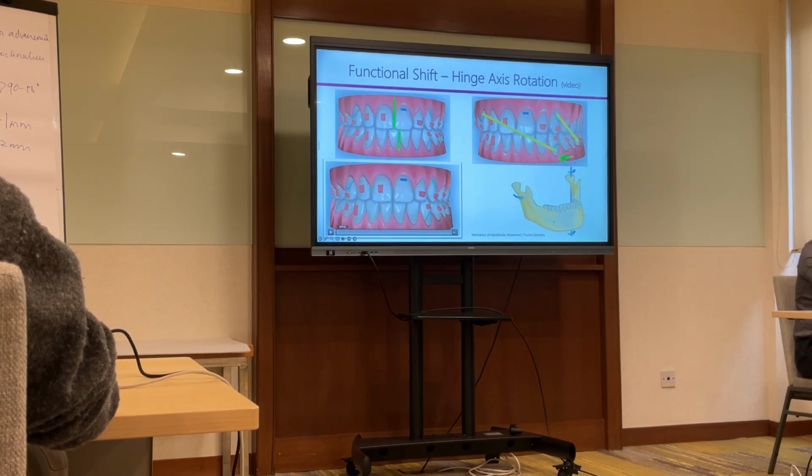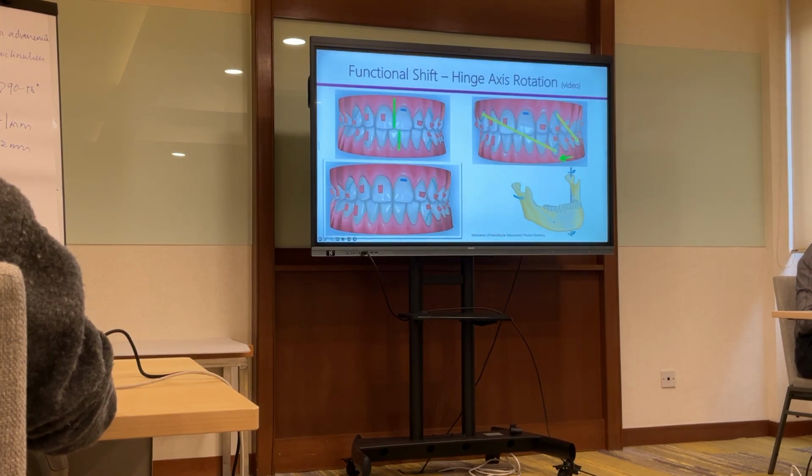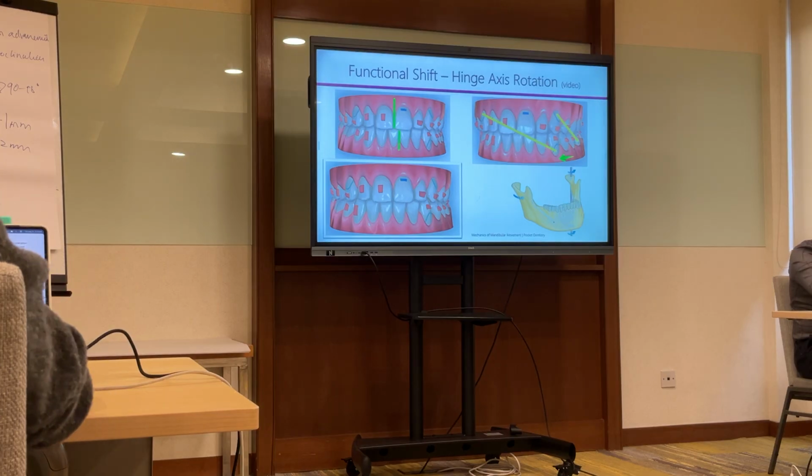If you want to use anterior cross elastics on aligners, you have to ask the lab to give you button cutouts in the aligners. You can see that this aligner has a cutout here, cutout here. Wherever you have a cutout, you will go bond a composite button, a tooth-colored button. And in your kit, you have that mold. Did you guys do the hands-on exercise for the mold in seminar 2, where you had to just fill the composite and then put it on the tooth and cure it?